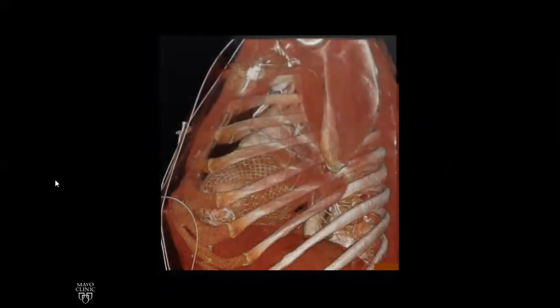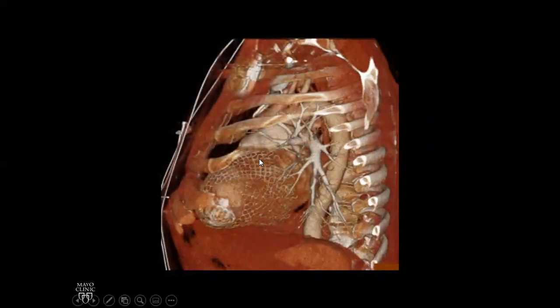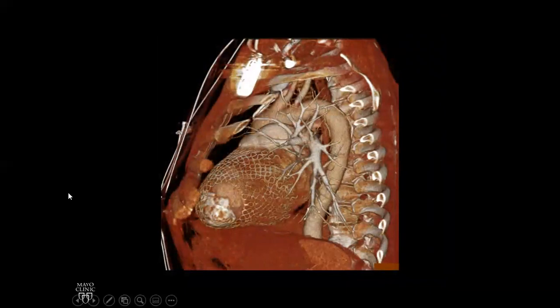See, 2 lines. Line here, dark strip between, and notice all this sort of structure here. This looks pretty organized and regular. You can sort of see it down here too. What is going on here? What's causing this? If we go to the CT scan in the same patient and we peel away, we can see this man-made sort of interlocking structure. This is a pericardial mesh. This is a man-made device that was placed outside the pericardium to contain the ventricles.